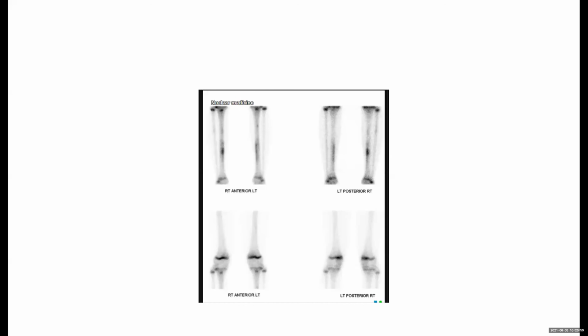Well, okay, soft tissue swelling and linear periosteal reaction can be seen in both situations. Yeah, the other leg is also affected. Yeah, there you are, there is linear periosteal reaction. So I think this is most probably due to stress fracture because he's using his legs too much. Thank you. Okay.